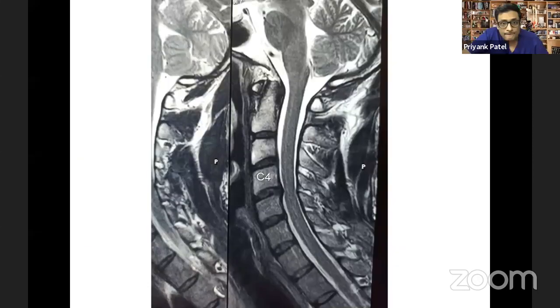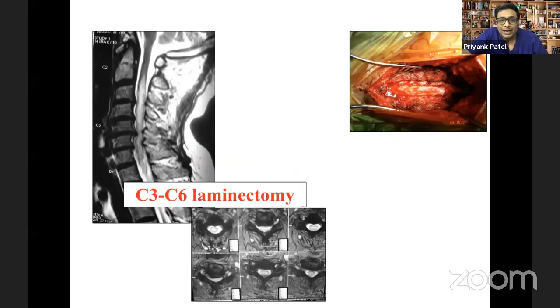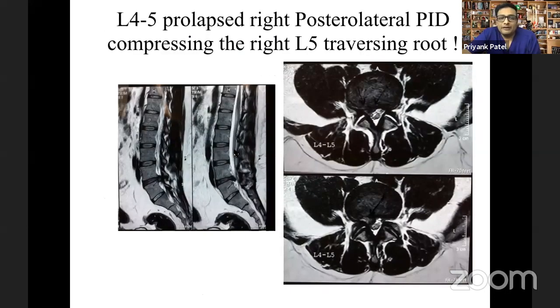So we have it. So remember what I told you. If you see this spine, this is a sagittal sequence, and I first want to stop sharing the screen and reshare because I'm going to show a spine model. So is the model visible over here? Yes, it is.